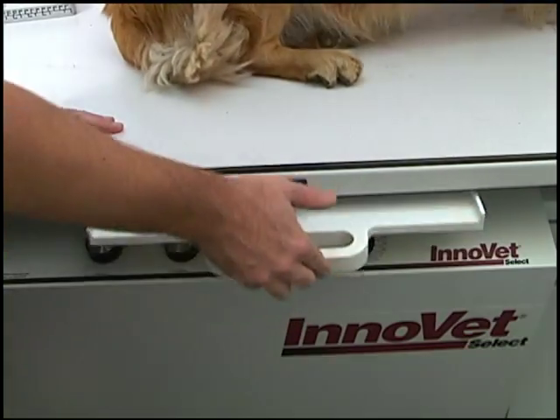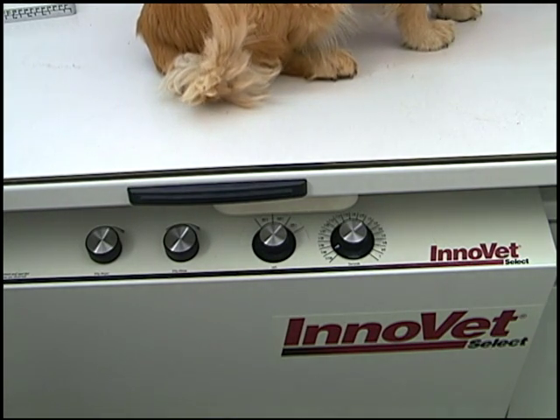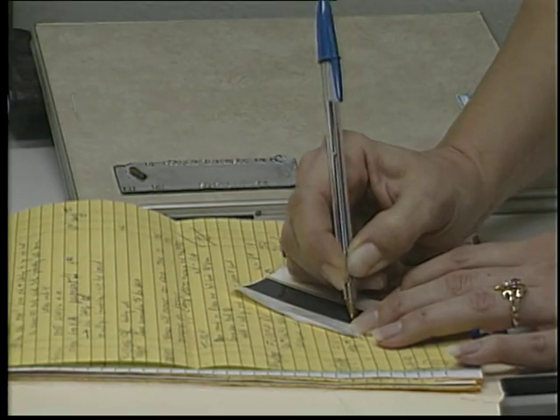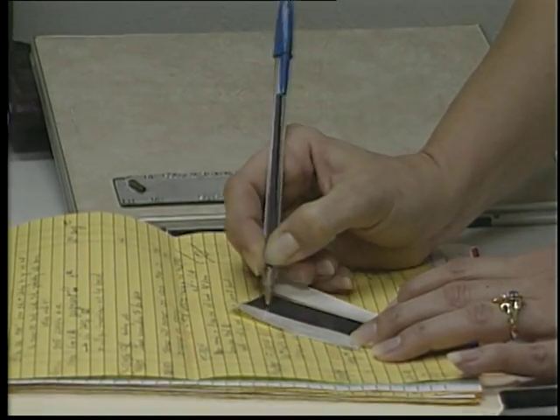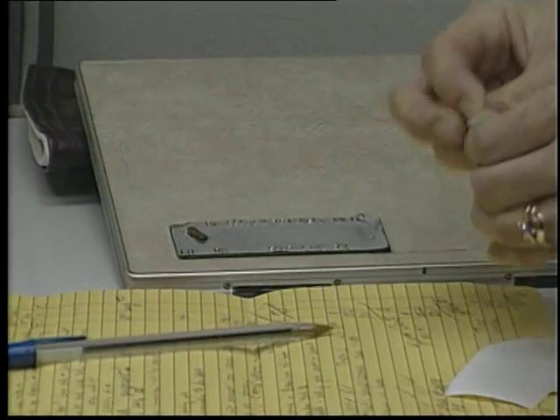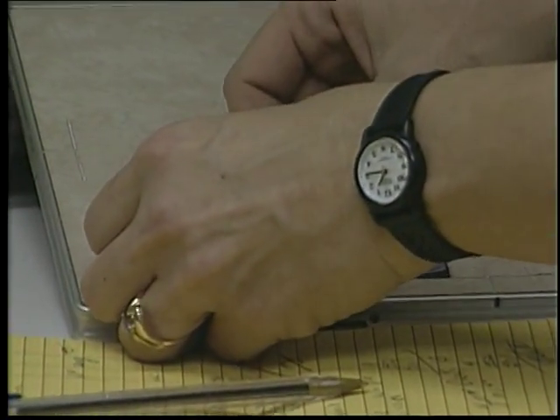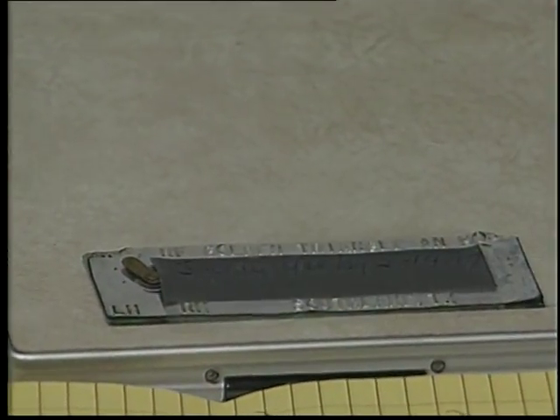Using a grid or a bucky will require an increased exposure of X-rays since not all of the X-rays will get through the grid. Because X-rays are part of an animal's medical records, they must be labeled with the patient's and owner's information, the date, and the hospital where the X-ray was taken. One way this is accomplished is through the use of a radiographic ID marker or radiographic tape. When placed on the cassette prior to exposure in an area not obstructed by the animal's body, they will produce a permanent ID on the film.